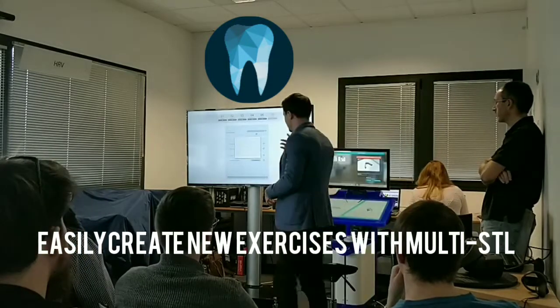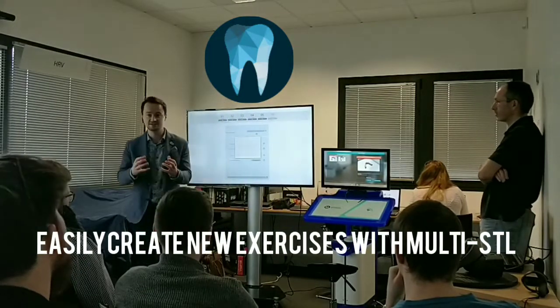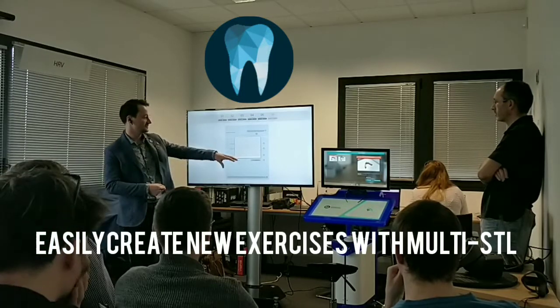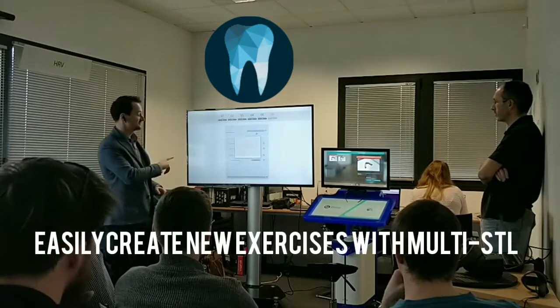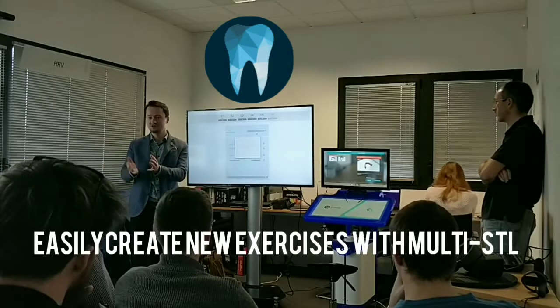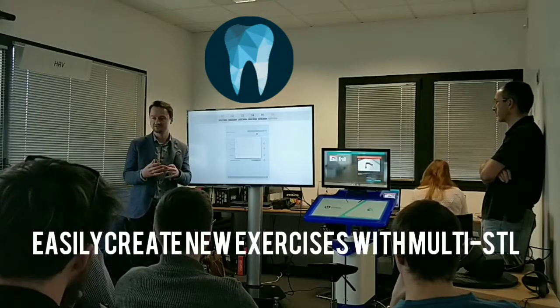There we go. So the system's just in the process of creating all the STLs that it needs for this exercise. And then we'll be able to load it straight away onto the simulator afterwards. Now, once this is finished, we're going to show you the second half of this, which is actually creating a new exercise based on a complete patient workflow.